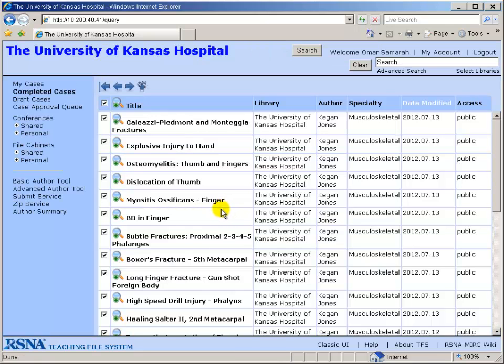And now that we're logged in, you can see this is our home screen, and we have an expanded toolkit right here. You're now ready to interact with the system, and you can skip to the next part of the video about materials. If you want to know how to access MIRC remotely, then continue on to the next part here without skipping.